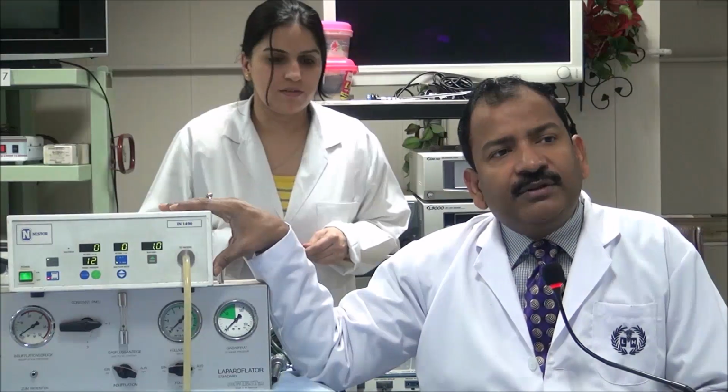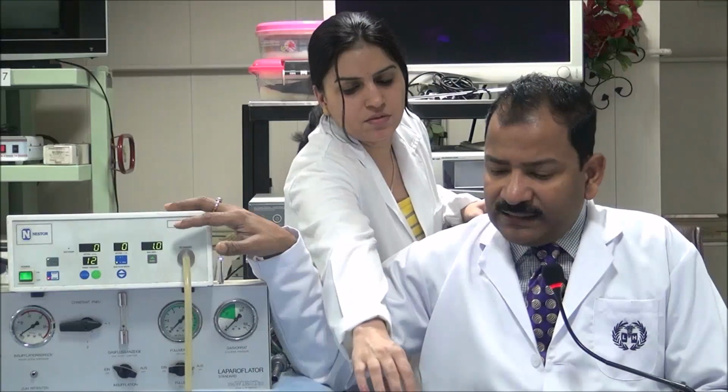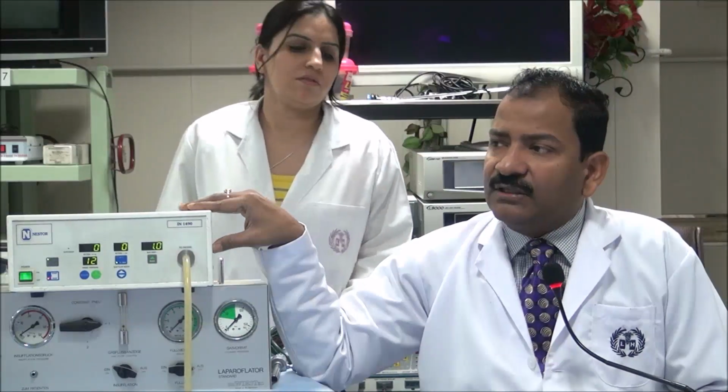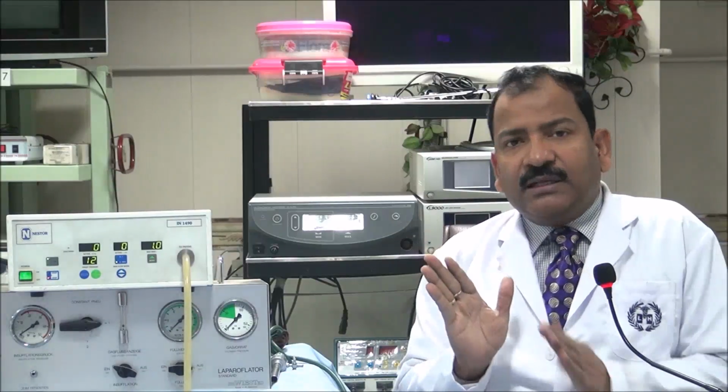So now the question is, these are abnormal settings. And you know, these questions are very important, which you have to remember. And this insufflator is such a beautiful instrument that within a few seconds it will let you know where the gas is going. Now the question is, these are the settings we will get if the gas is going to abnormal places. How will I know that gas is going to the correct place? If gas is going into the correct place, then the graph between the actual pressure and the total amount of gas used goes completely parallel. It doesn't converge and doesn't diverge.